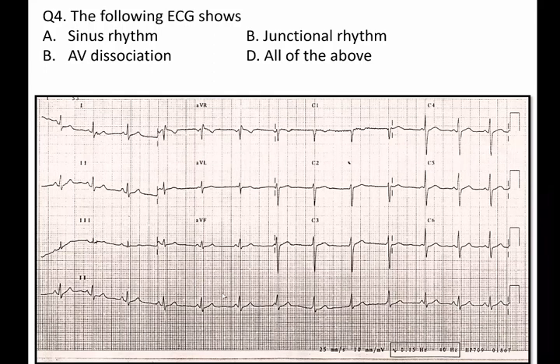But for the six QRS complexes in between, the P waves and QRS complexes are occurring at nearly the same time, and the apparent PR interval is physiologically not possible. So this P wave is dissociated from these QRS complexes.